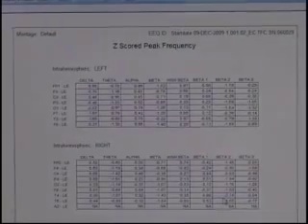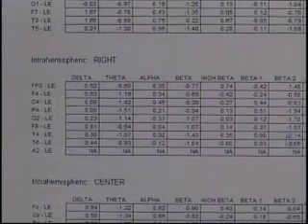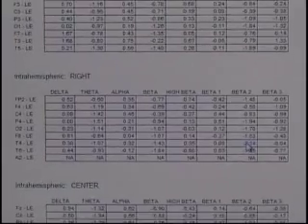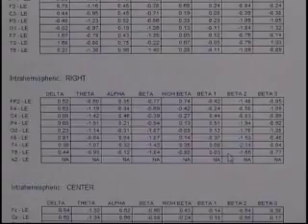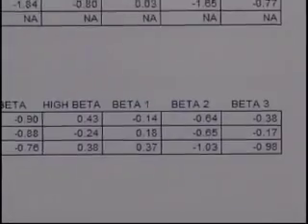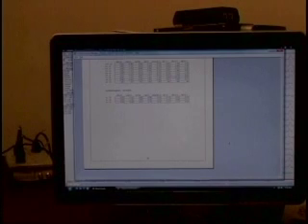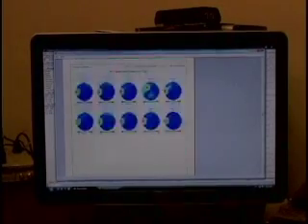We seem to have a little slow on T4. It thinks that the beta 2 frequency is a little slow. And that's probably because of that excess of beta 1 that we were seeing, and it's making it think that there's a little slow activity there in terms of the peak frequency being low. And that completes the report. This particular report was 24 pages long, and that is our eyes closed report using NeuroGuide.